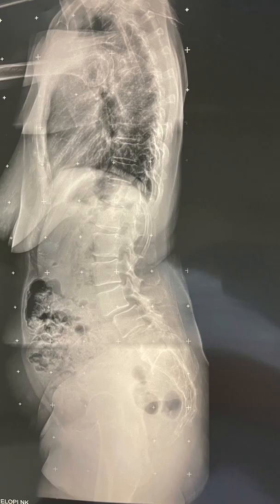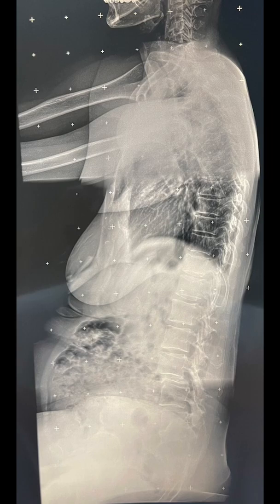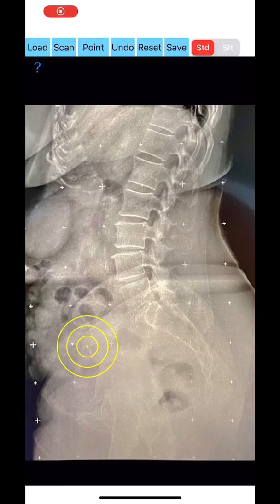At preoperative workup, before using the app, 2 radiographs should be taken: one standing lateral pelvis X-ray including the lumbar spine, and one sitting lateral pelvis X-ray including the lumbar spine. Once you load or capture the patient's image, by default the button STD is highlighted, meaning that you have to input preferably the standing X-ray to measure.